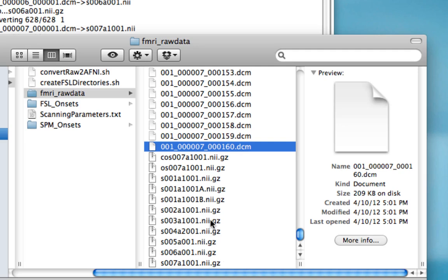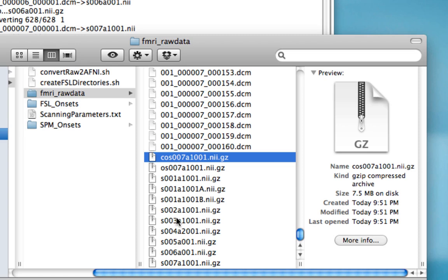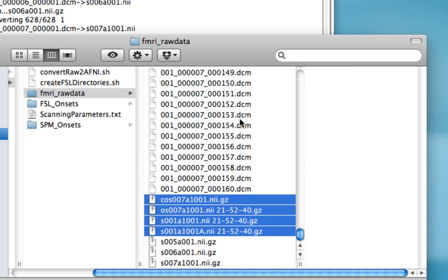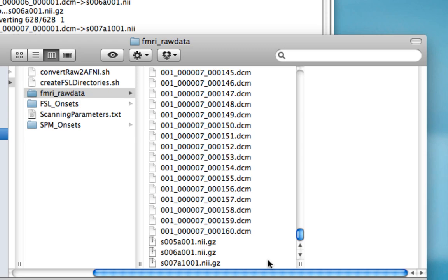The rest of these represent either redundant scans or images of the anatomical scan, or things like the scout scans, turboflash, and field mapping scans. For now, we're not going to focus on those, so we can go ahead and delete them. After you're done, you can use this to then convert all your other DICOM files for your other data sets.